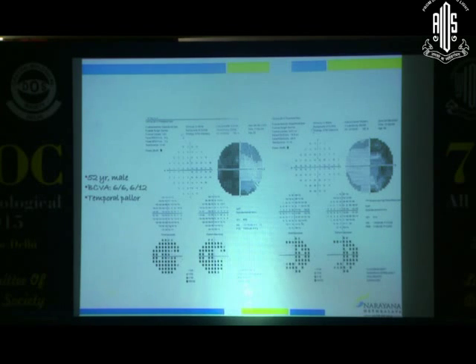So let's again look at this. What side of thing? Again, bilateral, right? So it is a neurological field. Both are following the vertical meridian, but is it homonymous or not? It is not. It is heteronymous. So when you're looking at heteronymous, what lesions are we looking at? Chiasmal. Only two. It's either pituitary or it is craniopharyngioma. So this is basically, and there is a temporal pallor set in already. So it's a pituitary adenoma.